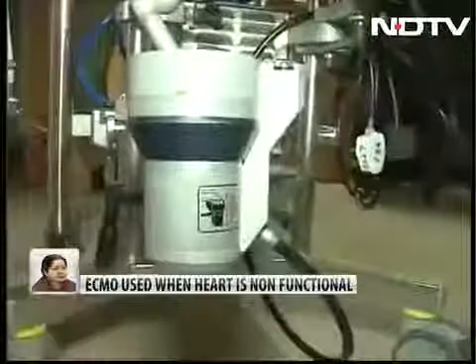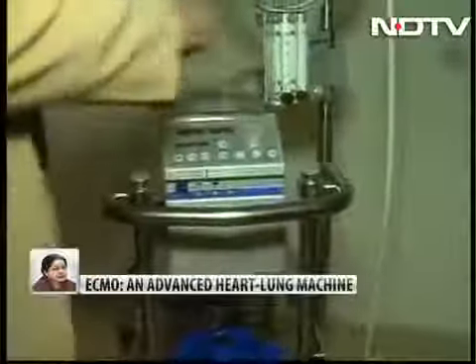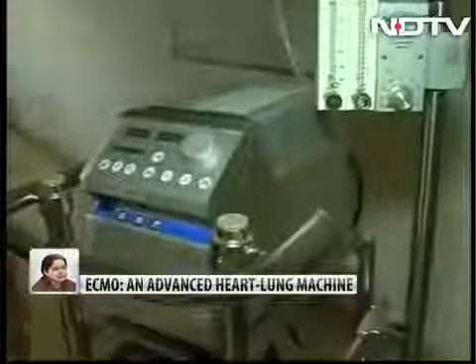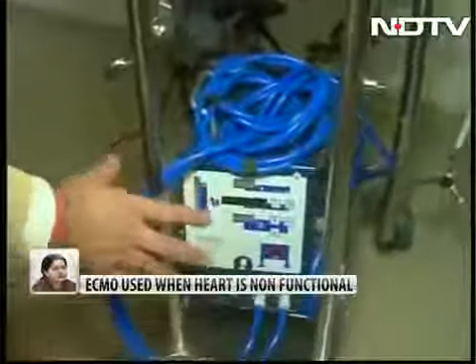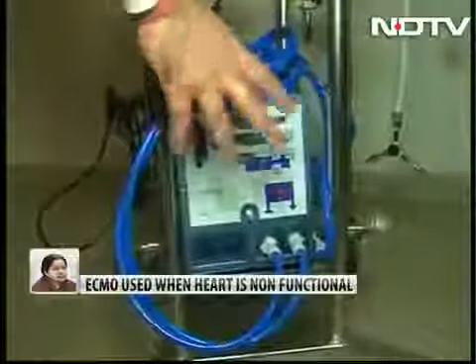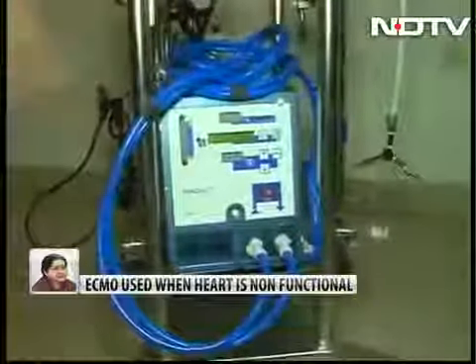So this is a controller. As you can see the numbers here, this determines how much blood is flowing from the patient to the system. That's a controller. This is a temperature controller. Because the blood is flowing out of the body, the temperature needs to be maintained, and this machine does the job of maintaining the adequate temperature of the patient.